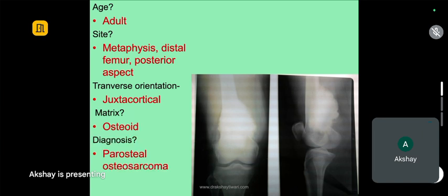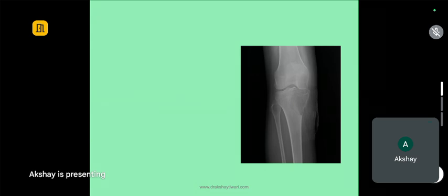Yes. Right? क्योंकि osteoid forming benign tumor तो ये हो नहीं सकता, because there is a significant soft tissue extension. Yeah, so that clinches it for you. You may not see a periosteal reaction, you may not see destruction because the matrix is so dense, but you can definitely see a large extraosseous soft tissue component, right? So it's an osteosarcoma.